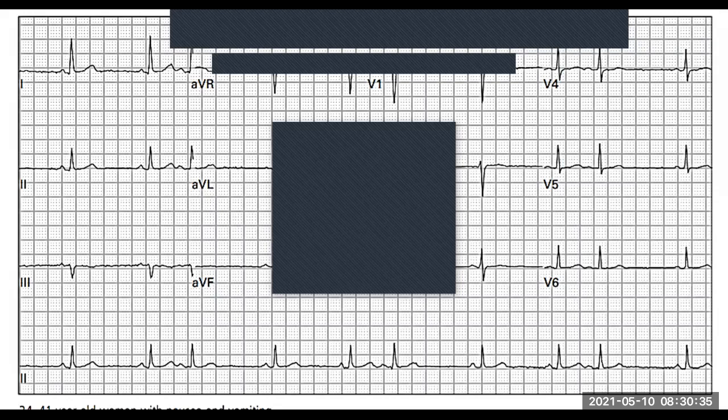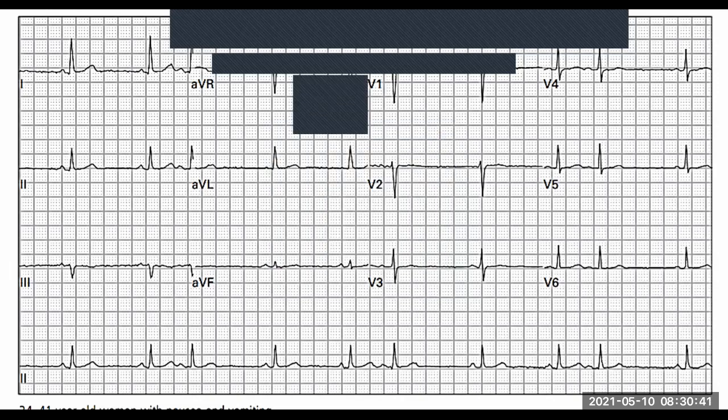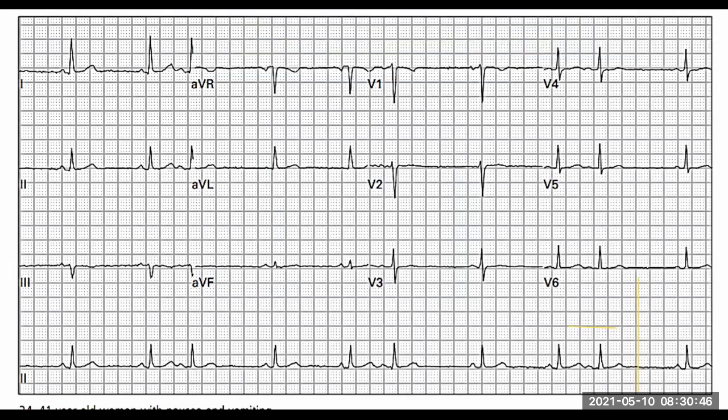Sorry about that. Okay, let's just clear that up. All right, so let's draw a little grid for us. We have this one yellow today. We remember we have lead 1, so just put a 1 there, and we had lead AVF here. Sorry, I'm trying to do my best.